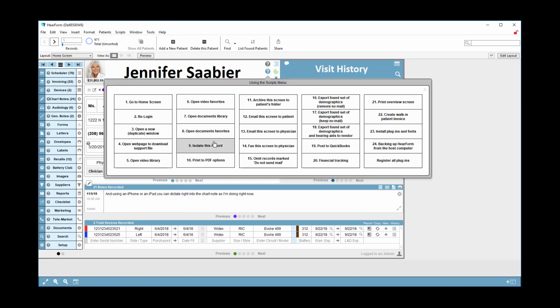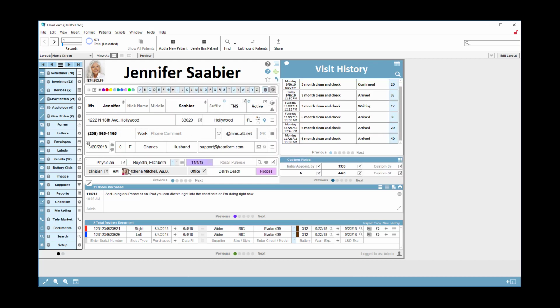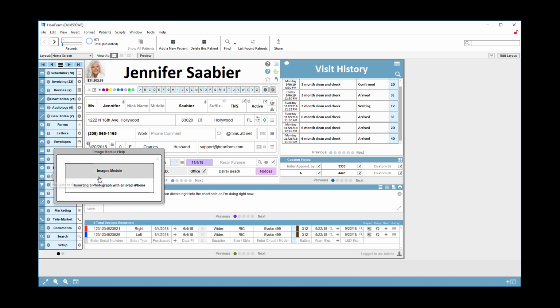There's a lot of buttons in this one because it covers a lot of topics. So there's something like 25 separate buttons to click there, and you'd watch each one as needed. Whereas other ones here, if I click the question mark, there's only a few, maybe just 2 in this case, maybe 1 in other cases, 3 or 4, etc.